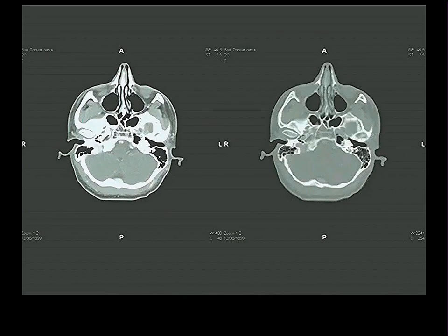Again, this is showing mainly bone. This is showing soft tissue and bone. And I show you this only because you can see so well in the one which shows mainly bone, the structure here, which is the foramen ovale. And that little radiolucency posterolateral to it, and that is, right, very good, foramen spinosum.